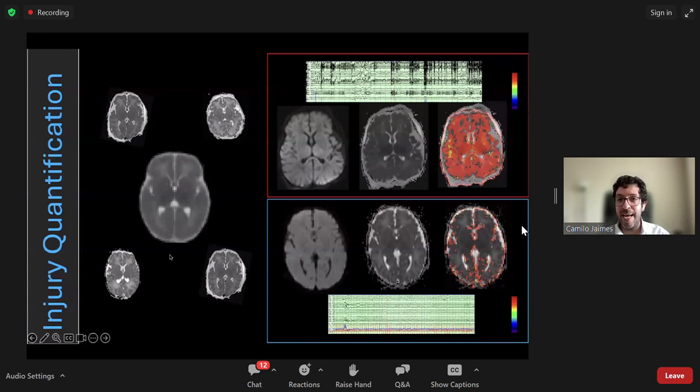virtual subject that's an atlas. And then you can register individual patients to that atlas and compute the Z-scores and see how far off the mean you are. So these were two newborns that were cooled. There was some equivocating about the newborn on the top to see if he had hypoxic ischemic injury, but you can see that horrendous EEG up top, whereas this one has a normal EEG.